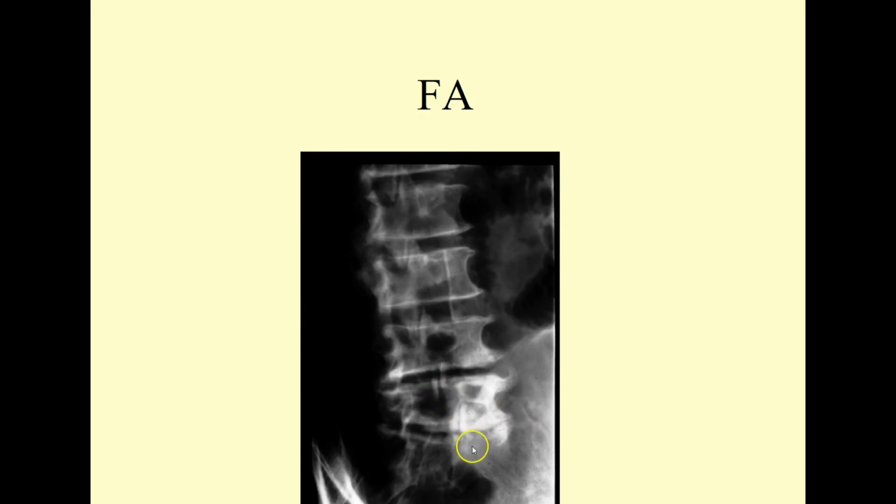Down here at L5-S1, you can see there's such a degree of joint space narrowing that the articulating facet of the sacrum is actually butting up against the pedicle-lamina junction, and before too long, it'll start remodeling rather significantly.